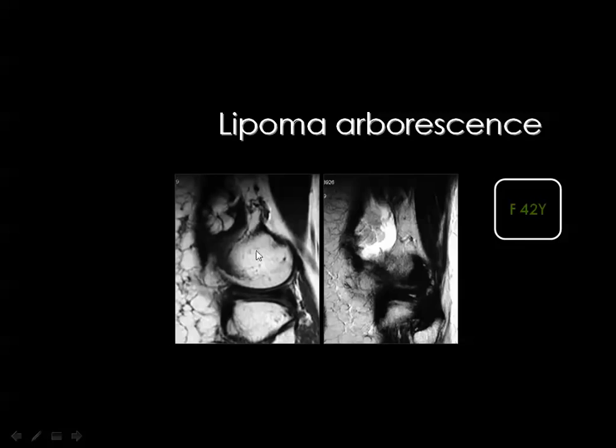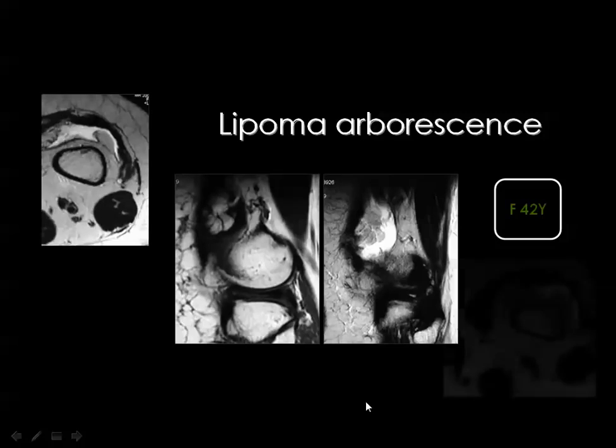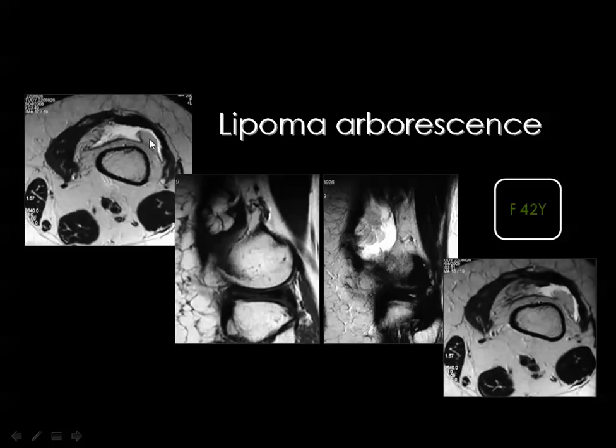This is a lipoma arborescens, T1 and T2 weighted images, and this is the axial image where you can see that the fatty masses are confined within the borders of the synovium.